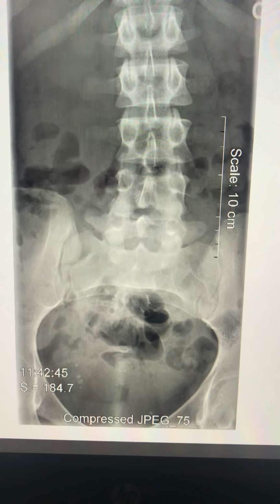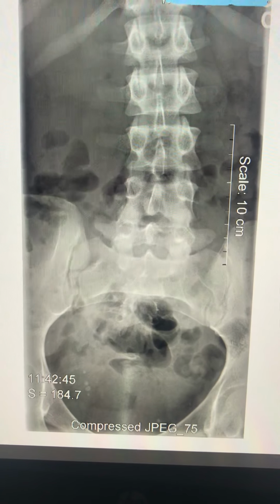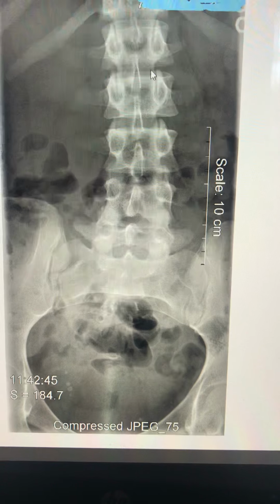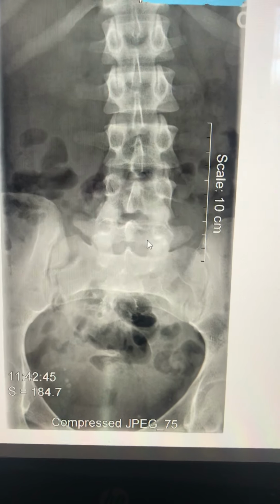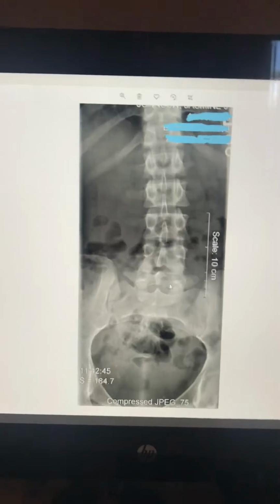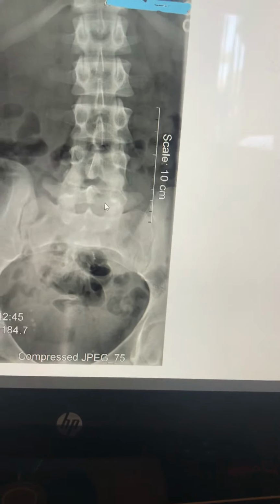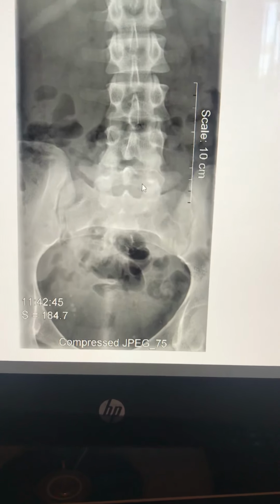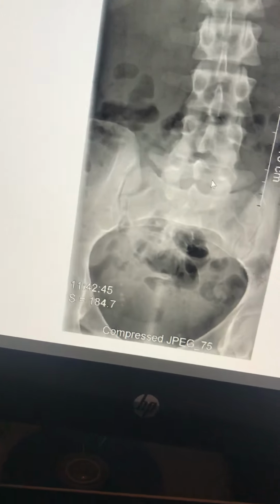The 5 lumbar vertebral bodies are shown. Joint spaces are seen. These are 1, 2, 3, 4, 5. And the transverse processes are seen. The SI joints are seen. The sacrum is hard to see through the gas pattern. A shield was placed over her chest to protect the breasts.